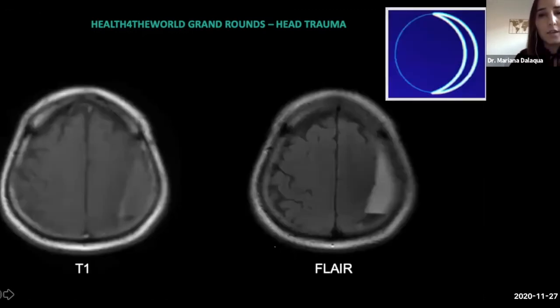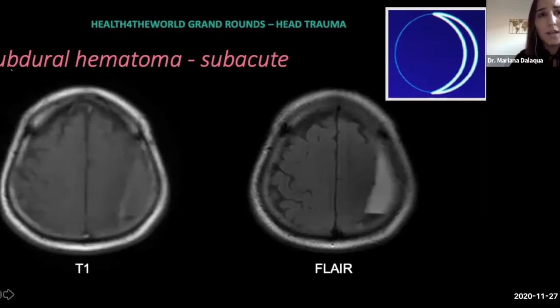So if you look at the same thing in the MRI, we see that subdural hematomas already have methemoglobin. So methemoglobin has a hypersignal on T1, has a hypersignal on FLAIR, usually after the third day that it appears. And here we see that there is a little deposit of the figured elements of the blood posteriorly. Okay, so here's the aspect on the MRI of a subdural hematoma.